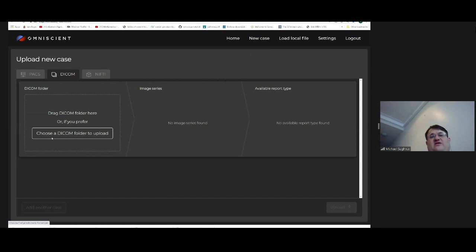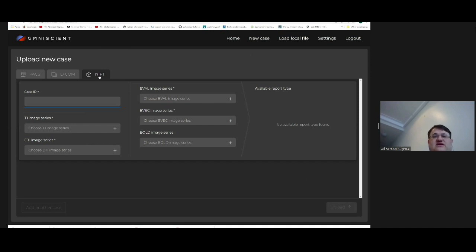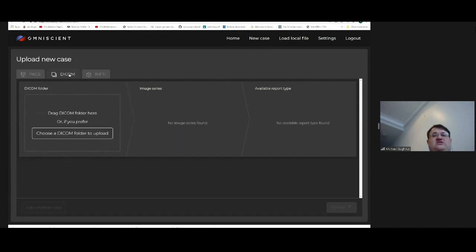It's actually possible with an API integration to use your own PACS to re-identify it if you were doing this for treating a patient. But given that most people taking this course are probably researchers, it actually does all your anonymization for you as well. We have multiple safeguards that prevent us from transmitting PHI of any form. And so this can really simplify your workflow by not having to do your own NIfTI conversions. But if you're working with NIfTI data, this has the ability to work with this. The only thing is that you have to name your own case. So as you can see, we try to make this as flexible as possible to get data in and out.